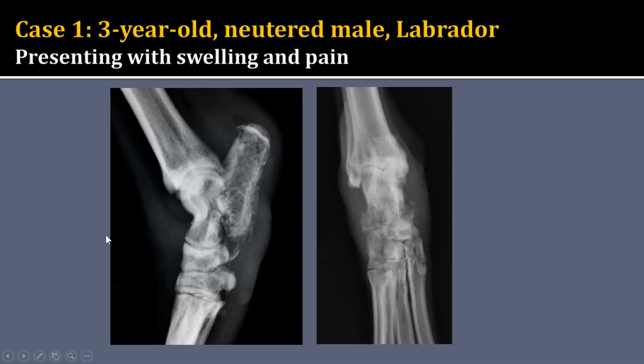Now, my next step was really finding the obvious or the holy cow finding, but I'm going to skip that for now, and I'm going to go into my third step, which is looking at the study systematically. And one system I had told you you could use is to start with just overall alignment of the structures, and this looks like it's well aligned. I don't see any obvious fractures or any disarticulations.